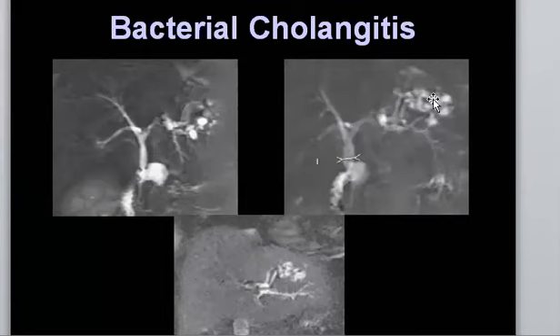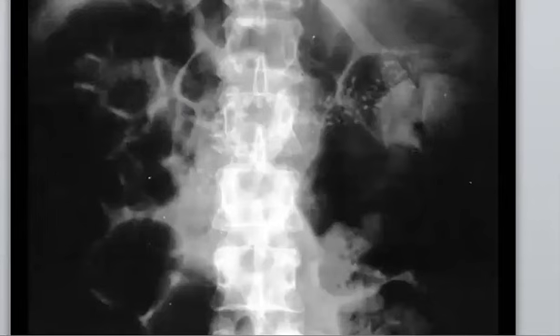They mentioned that there is some communication with the biliary system. And there is some filling defects. Okay. So what do you think about this case?